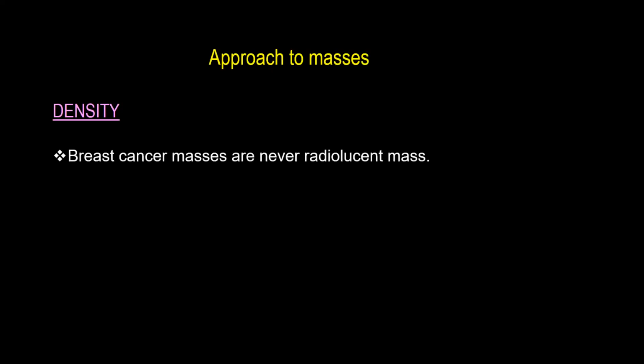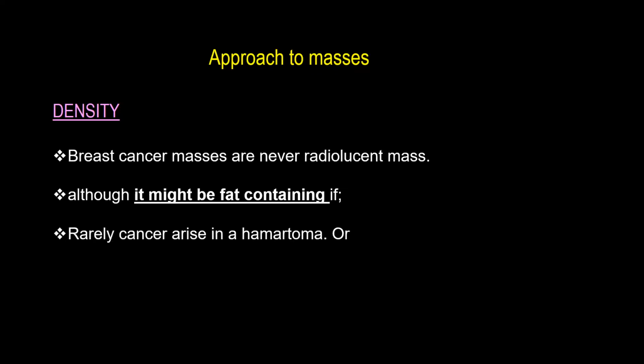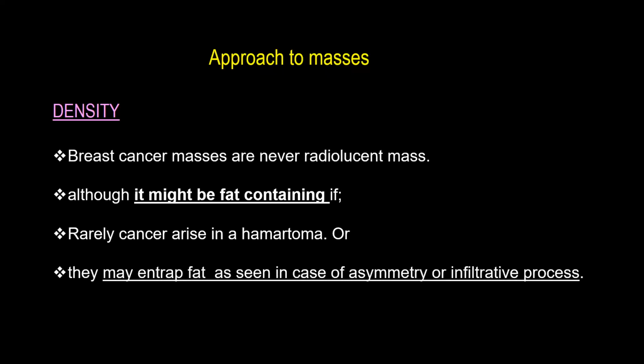So regarding the density, breast cancer masses are never radiolucent. A mass that is homogeneously radiolucent will never be a cancerous mass. Although it might be fat containing if cancer rarely arises in a hamartoma, or cancer entraps the breast fat, you see, in a case of asymmetry or infiltrative process.